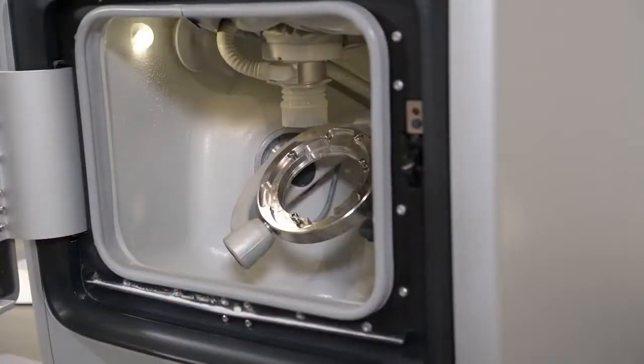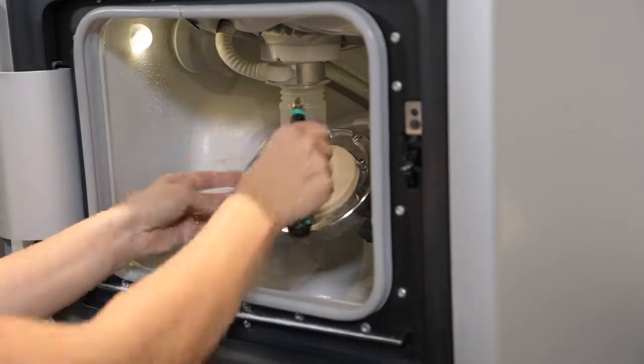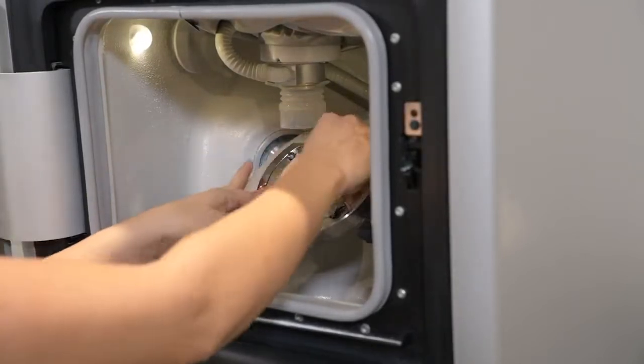After inserting the tool magazine and the disc, the milling job can also be started directly on the inLab MC-X5 by pressing the Start button.